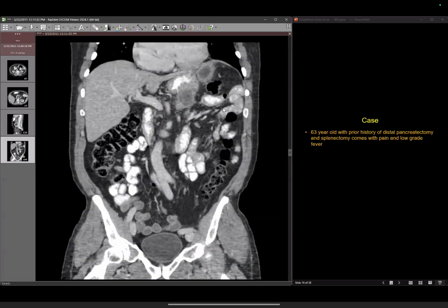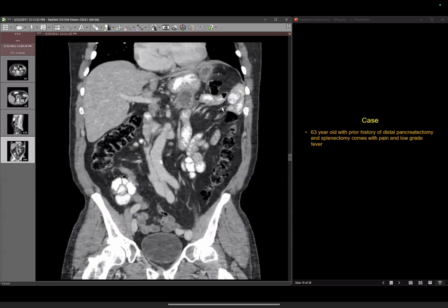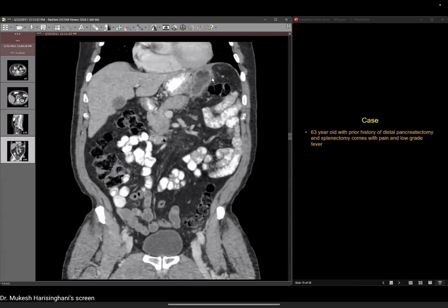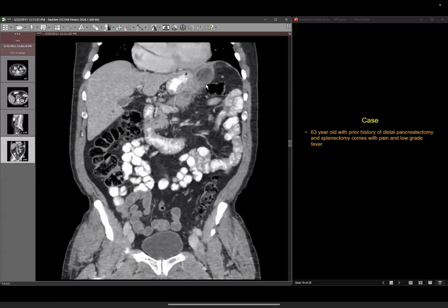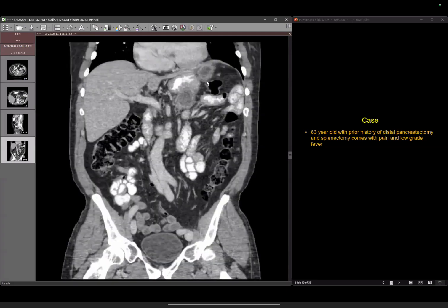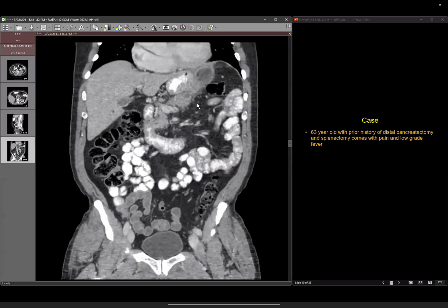In the history of fever, it could be a collection in the post-operative bed. Yeah. But more often than not, if you see this after an extensive surgery, these are typically areas of fat infarction, or fat necrosis. Now, if they are in the omentum, they are called omental necrosis. If they are seen in regular peritoneal fat, that's fat necrosis. But can you be confident they are?